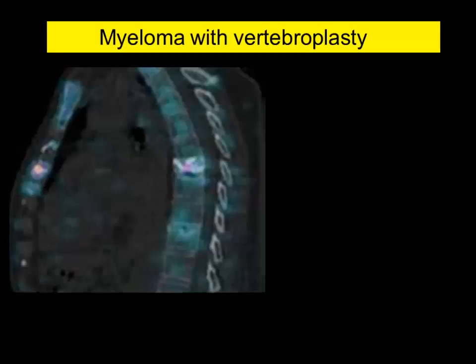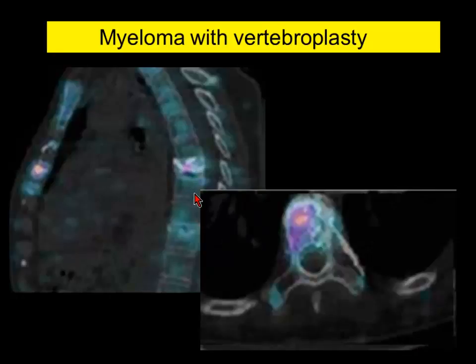And in this patient, you see focal uptake in this region, otherwise the rest of the thing is fine. And on this lateral segment it is hot. So this means they have done kyphoplasty with vertebroplasty, but they haven't put adequate cement in. They have covered the center and the right side, which is fine.